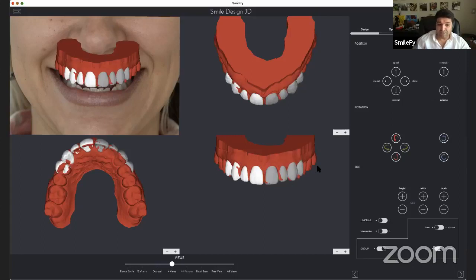So we need to consider the ideal design is actually right ideal, and the mock-up needs to be more additive, right? So now I'm going to select the central, for example, and make small adjustments and adjust everything in my design.